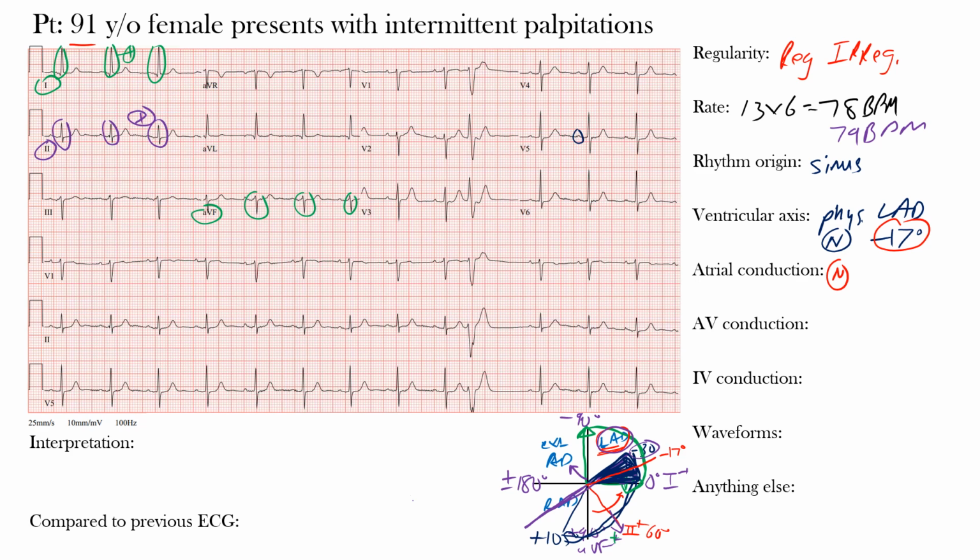Okay, so if you just look here, here's lead 2, and you can see clearly that it is again within normal limits. It's less than 200 milliseconds, so we have a normal PR interval. And it was actually on average 160 milliseconds, so less than 200 milliseconds. So that's what we consider normal AV conduction.